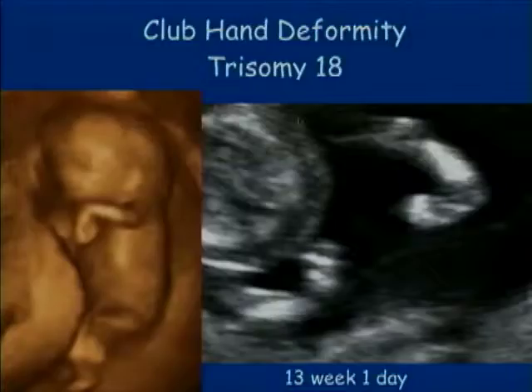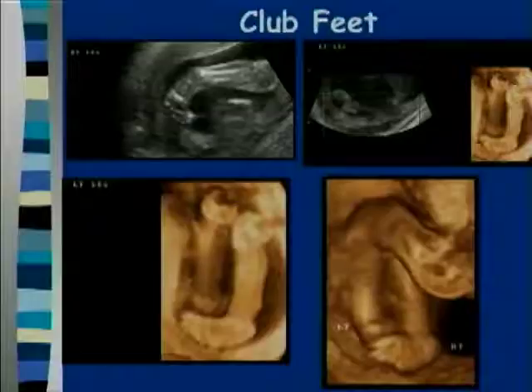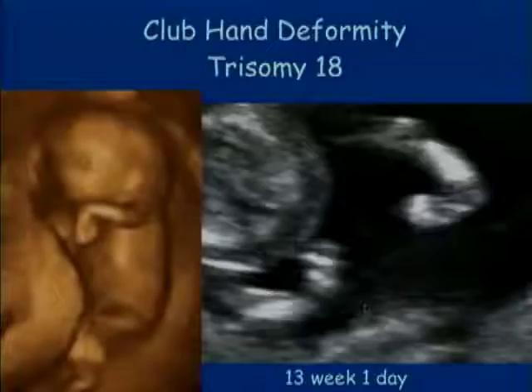We do use it for club feet, like in this patient, where you can see it of both the right leg and of the left leg. And here you can see it. I don't have the video to show you it rotate around, but I think it can be quite helpful to confirm a club foot.